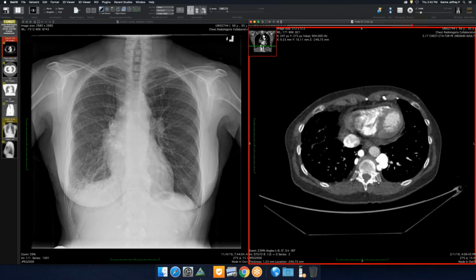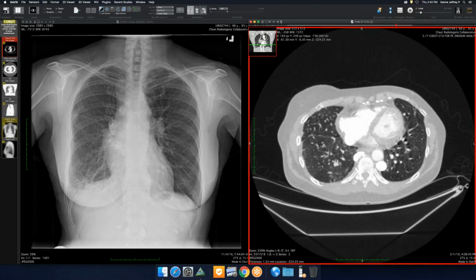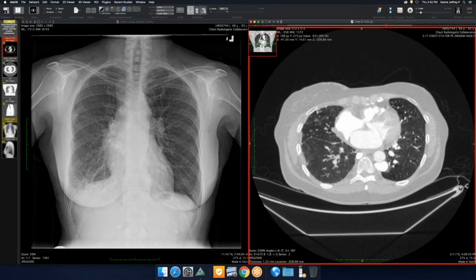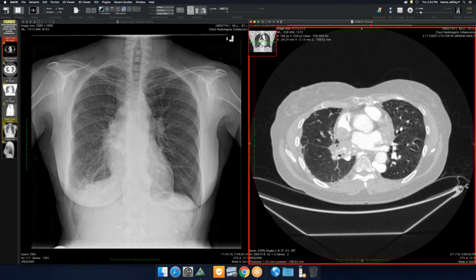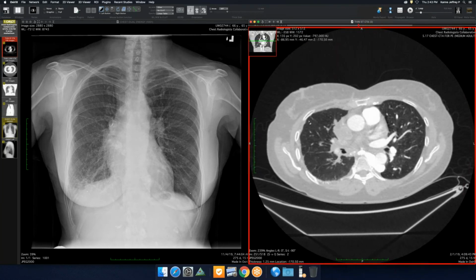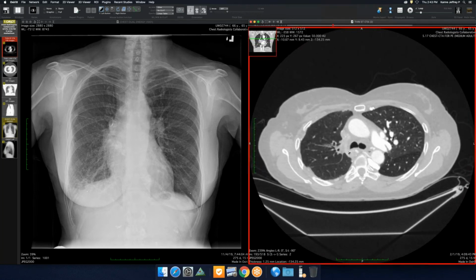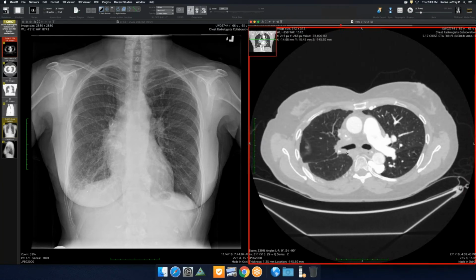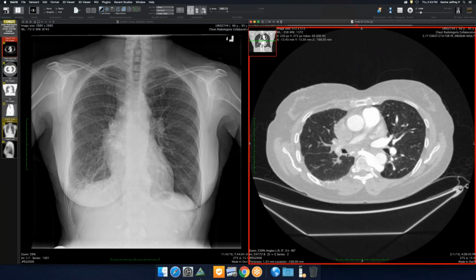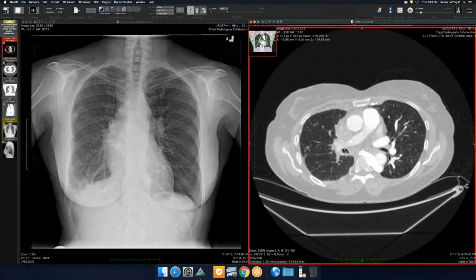And then if you look at the lungs, you can see there's nodular thickening along the pleura, there's septal lines, there's bronchial cuffing, there's even some really tortuous vessels in here. So there's probably a lot of transpleural collaterals. So this is a case of fibrosing mediastinitis that's taken out most of the arterial and venous flow. The airways you can see are still open, a little bit narrowed. But effectively there's very little functioning in that right lung.